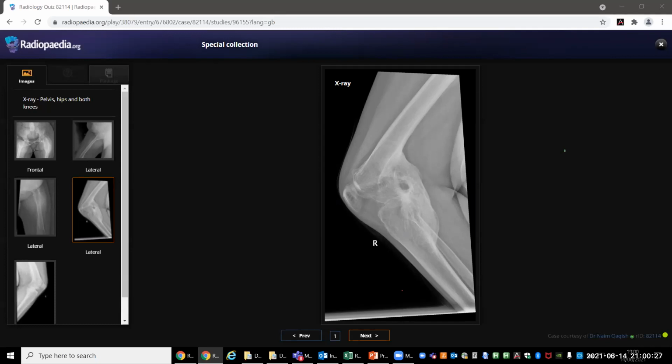You can't remember the differentials of this? Well, the differential in this case could be an infection, maybe a chronic infection with bone formation, or post-trauma, or maybe soft tissue formation, like endocrine disturbance like hyperparathyroidism, but there is no loss of bone density, like renal osteodystrophy. Okay.